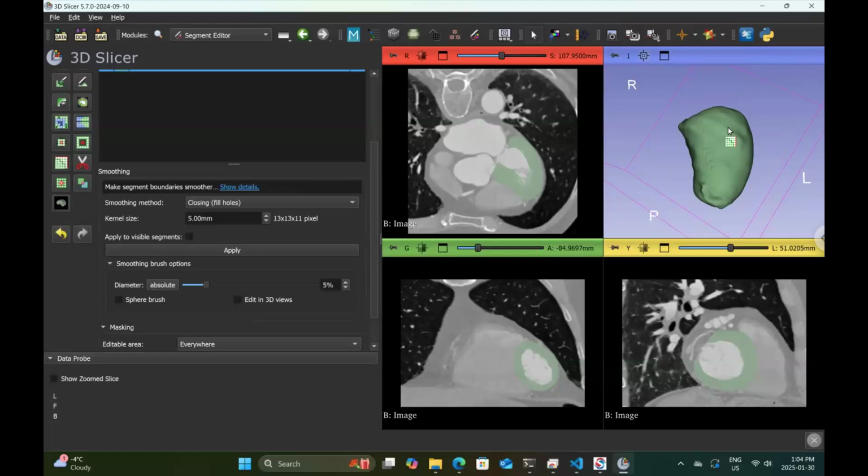You mean all of the atriums and the ventricles, or just the left ventricle? Yeah, that was essentially my question. I noticed that we've added the aorta now. Are we adding that and the left ventricle and then that's it, or are we doing all 4 chambers?